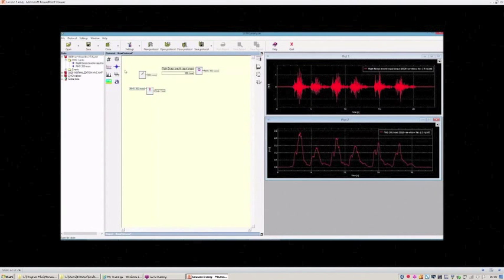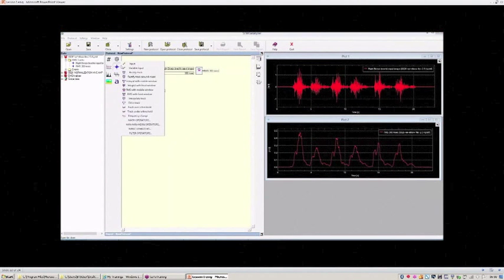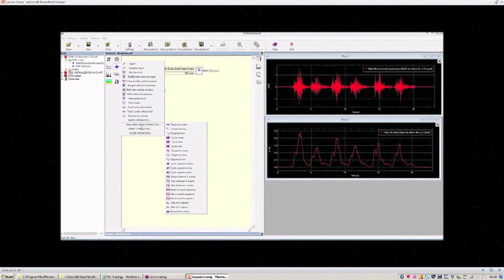Now we can choose the operator under the event operator, event defined value, to define the value of the peak. The input is the envelope of the signal and the events. So this is the value of the peak.